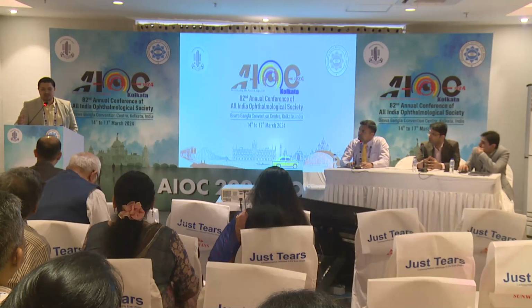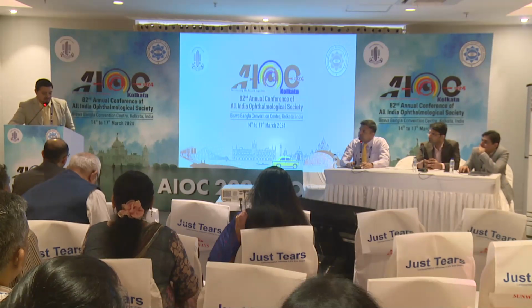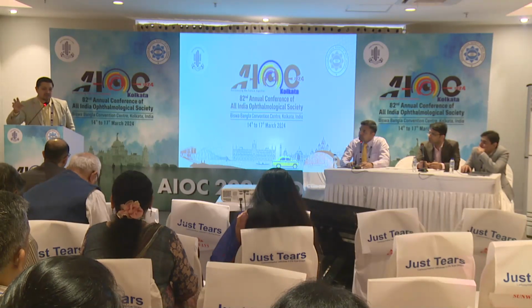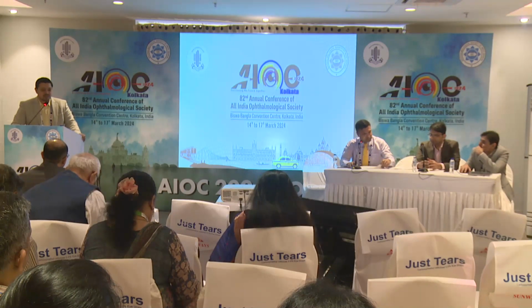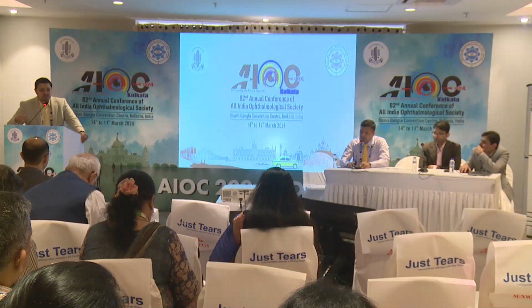As I have mentioned before, FFA has the benefit that it can show leakage, but this is also the benefit which acts against it. As Dr. Vinod has mentioned, if you have a wide field FFA, then it's a beauty. You can in one click get the CNP areas which are very well seen. But if you do a conventional FA, you can't scan all the sites at the same time. So do an OCTA in this patient. Even if you are not taking it at the right time, it's just a scan, do it, and you can easily pick those CNP areas. This will tell you how burnt out the retina is, and it will help you understand whether your treatment is doing any benefit to the patient, or you need to step up the treatment. Thank you.